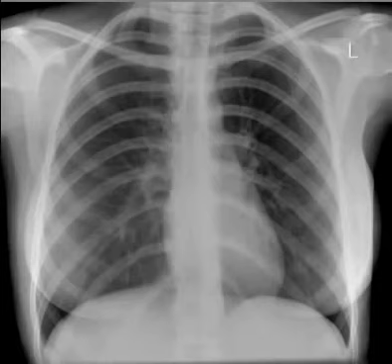The radiologist will then read the history. This patient presented with the history of abdominal pain 2 weeks after surgery for appendicitis, and the treating physician is suspecting a bowel perforation. Suspected pathology, if there was any, would be visible in this case as free air under diaphragms, which of course is not there. So this X-ray does not have any sign of bowel perforation.